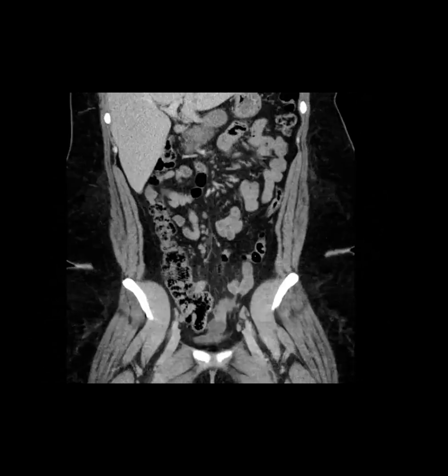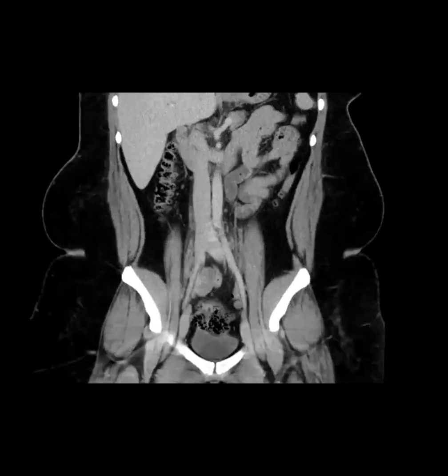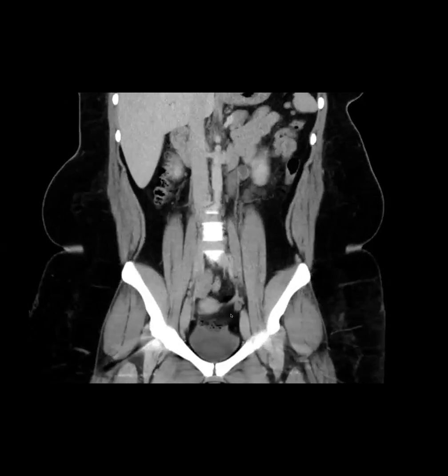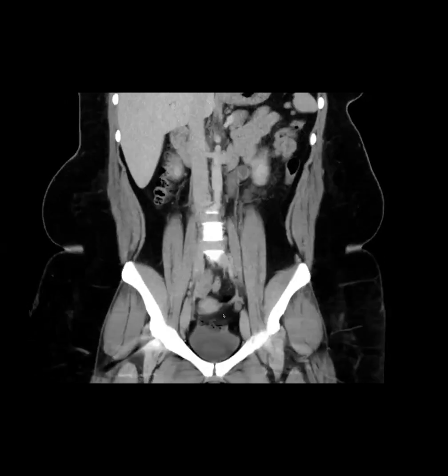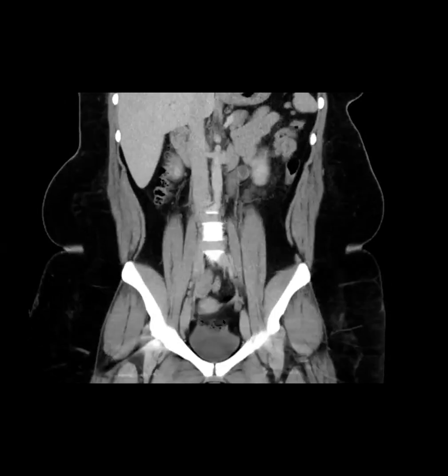And then actually this was, what'd you say? The mucocele. Yeah, well, that's actually a little bit of the point that I was talking about with my fellow. I'm not sure that this is a mucocele versus obstruction of the appendix by this adenocarcinoma here. Was it mucinous at path? So the path is actually goblet cell with mucinous features. So at this point, we can't really tell whether this was a mucocele or is it obstructing it and then causing this accumulation of fluid. I guess if it was truly obstructing it, we would see more inflammation. So this could be a mucocele.